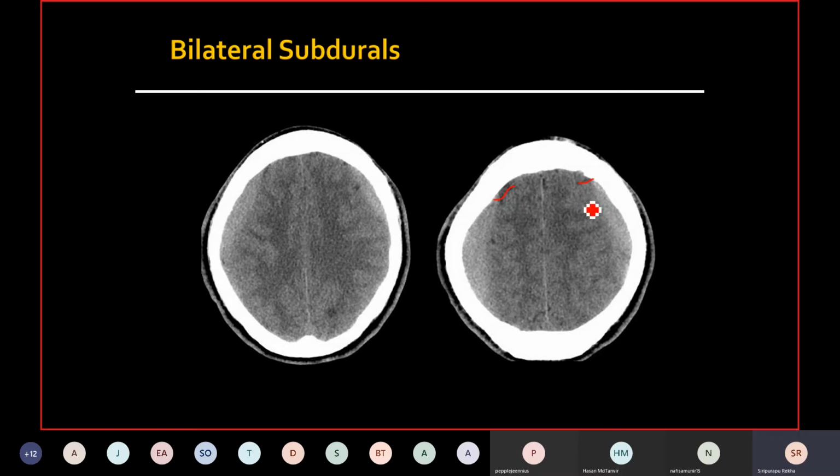When you draw the sulcus, and if the sulcus stops short of going to the calvarium, then you have to take a closer look for subdural. If you don't see any sulci, such as here, then the other thing I tend to do is look at the white matter arborization. If you draw lines along the white matter arborization, you see that they stop short of the calvarium, so they're not going all the way out. That's another way to pick out these subdurals.